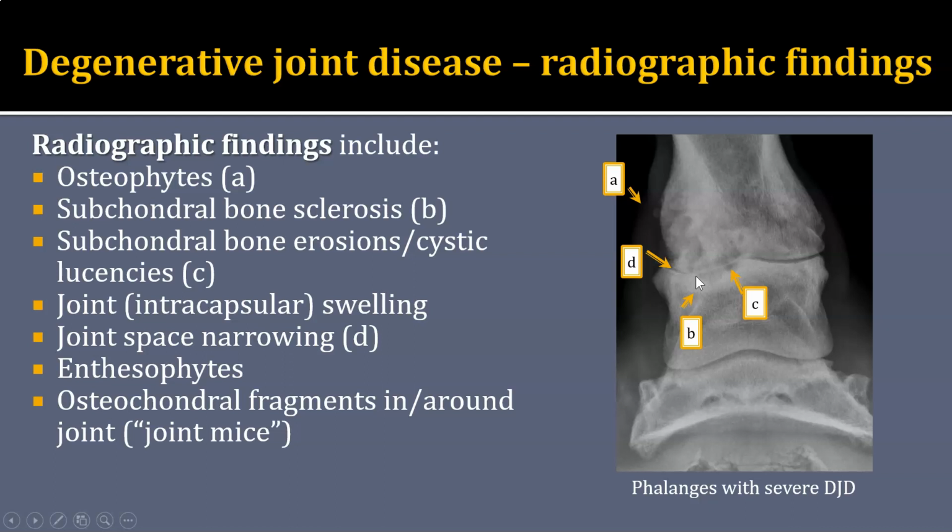So in the horse, when the horse is weight bearing, which this horse is, we can be more confident about identifying joint space narrowing, especially when we compare this proximal interphalangeal joint and how it's very narrowed on this side compared to the other side, to the more uniform space of the distal interphalangeal joint. So that can help us.